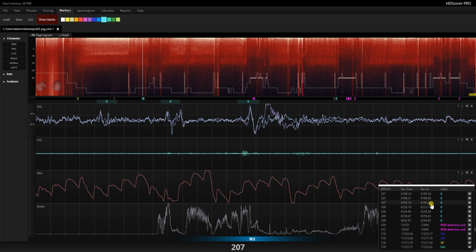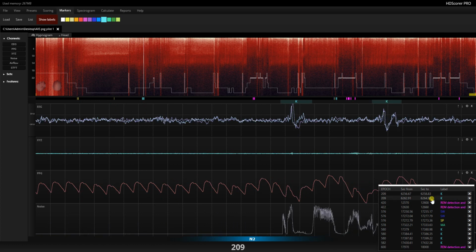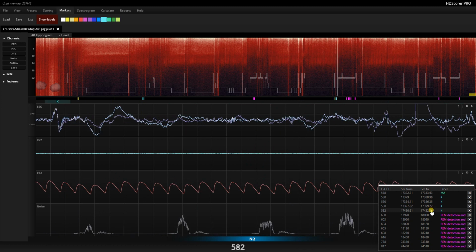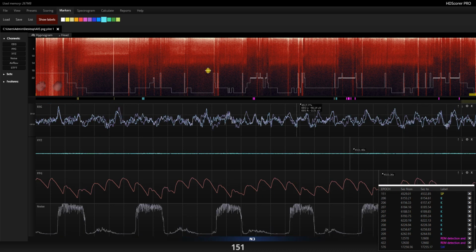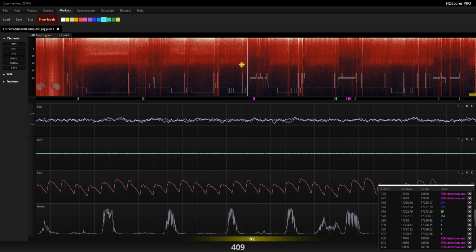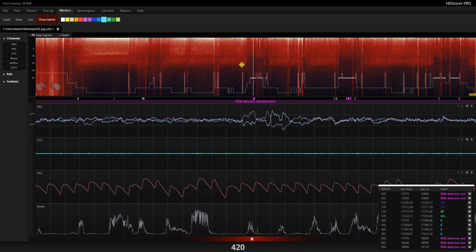So I'm still finalizing the interface. For example, if you click here, the fact that it then scrolls, so you're not able to go through one after the other, is a little bit problematic. But basically the use case here is you should only click one if you want to go and see what that is, but then mostly you would use the arrow keys or the mouse to navigate. At least that's how I intended it, but still subject to change.